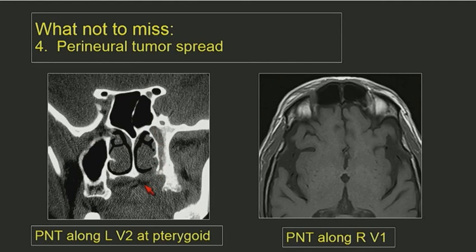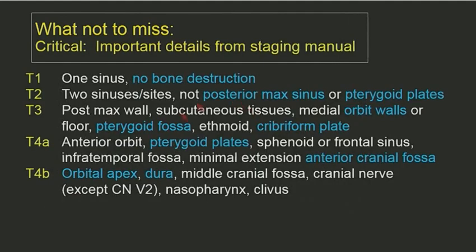This was called normal. Here's a patient that was called normal, and look how close the supraorbital foramen is to the frontal sinus. So when we're doing sinus CT, we may not be aware of it, but we see the supraorbital nerve and foramen on every single case. If you live in a place where there's a lot of sun exposure and see a lot of skin cancer, you are probably very familiar with this perineural tumor coming back along the first division of the 5th cranial nerve. This was called normal.